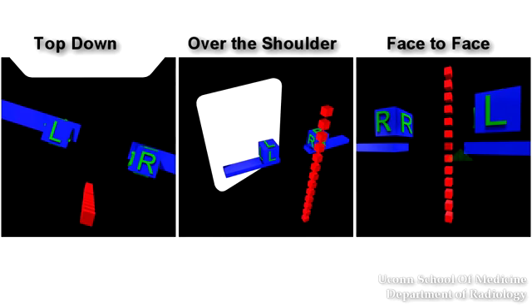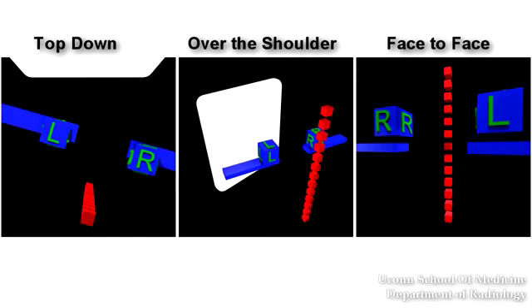If you notice here on this radiograph perspective view that the medial head of the clavicle appears to be closer to the vertebral body than the right side. So this is how you can actually tell if the patient is rotated on a chest radiograph. If you notice that the vertebral bodies or the line of spinous processes are actually closer to one medial head of a clavicle than the other, then you can tell which way the patient is rotated.